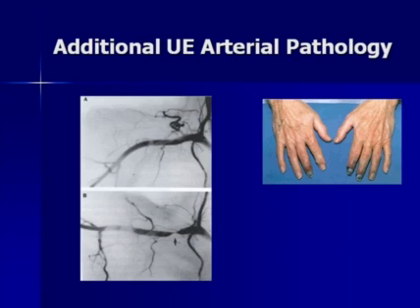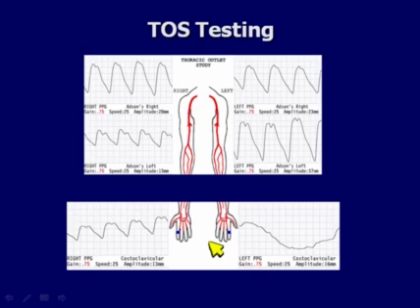This is a patient with Buerger's disease completely, and almost all of them are associated with heavy cigarette smoking. They get this digital ischemia and cyanosis. Here we have a radiograph showing, an angiogram I should say, showing thoracic outlet compression with a normal subclavian artery at rest. The arm is moved into a certain position and we get compression of the subclavian artery.